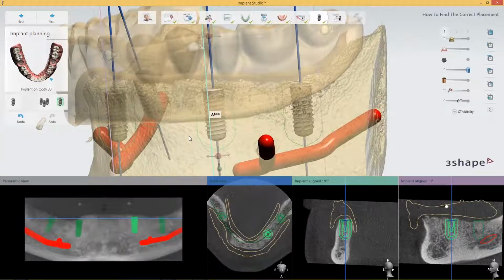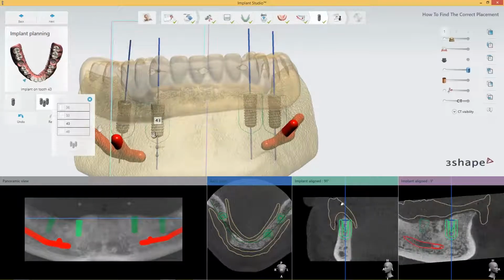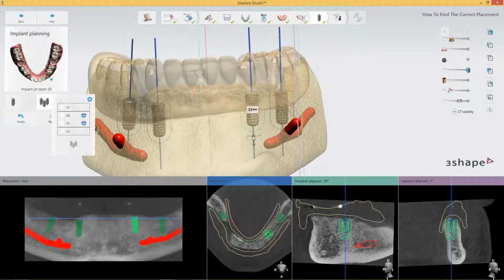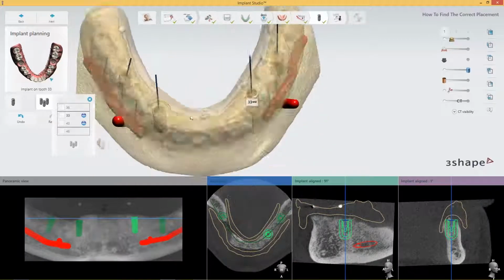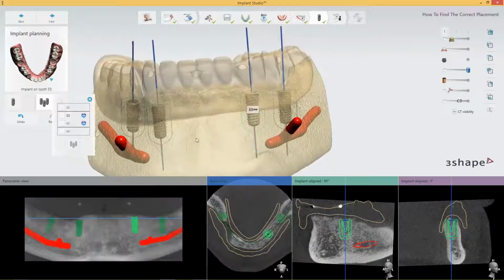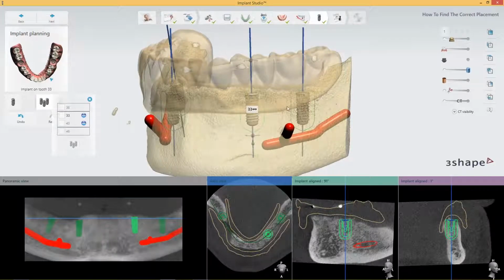If I don't feel that this grouping is the most correct one, then I can always go in and edit my groups, undo them, and then I could say actually what I wanted to do was to make sure that these two were grouped. Then again, I would simply work with these two linked, marked by the link icon also, and then I can ensure that I get exact same insertion. So that's the functionality we have at present with that. And if I wanted to create more groups, then I would just go in and mark again.